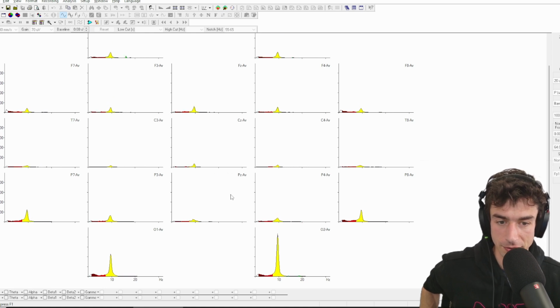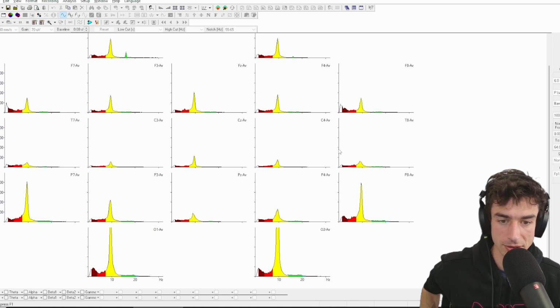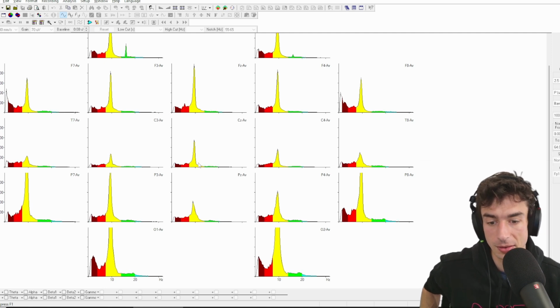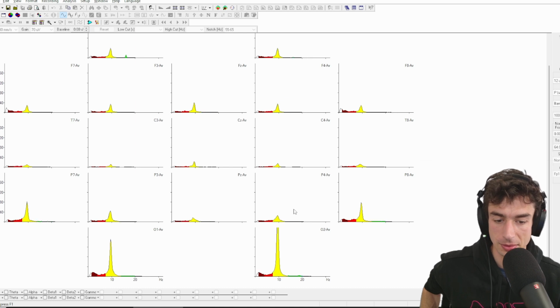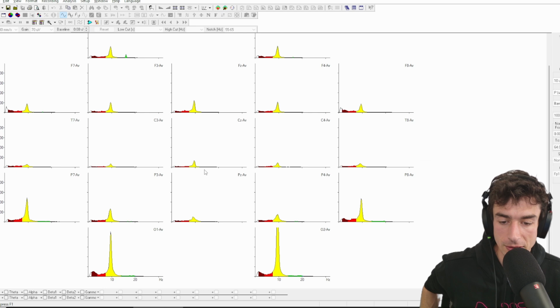The alpha topography shows PZ kind of having the lowest amplitude, except for the central sites, which we don't love to see since excessive alpha in these areas in comparison to PZ can sometimes be associated with sensory processing issues. And we don't know that, but it's interesting nonetheless.